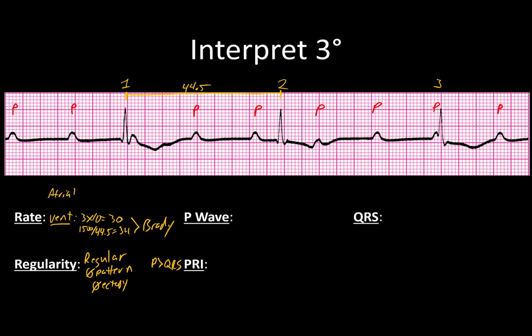Well, I can just look, and if I take one quick second, I can see that in beat number 3, the very start of it, there's a P wave immediately followed with a QRS. In beat 2, that's a normal looking QRS, right? It just has the small q, big R, small s. And then if I look at beat number 1, I notice that I have my little Q, my R goes up, comes down, and then I immediately have this little bump after it. And sure enough, that's my missing P wave. It's not a T wave, it's a P wave.